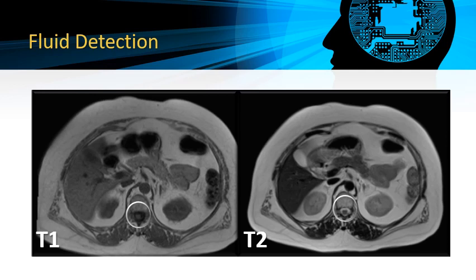And it's very important because sometimes you are confronted with special or selected cuts, and you don't have the normal fluid-filled spaces. So remember to check the CSF of the spine. Another clue in the image: the yellow arrow refers to the gallbladder. The gallbladder on T1 has a low or dark signal, while on T2 it has a bright signal. So this means that fluid is dark on T1 and bright on T2, whatever body part you image.